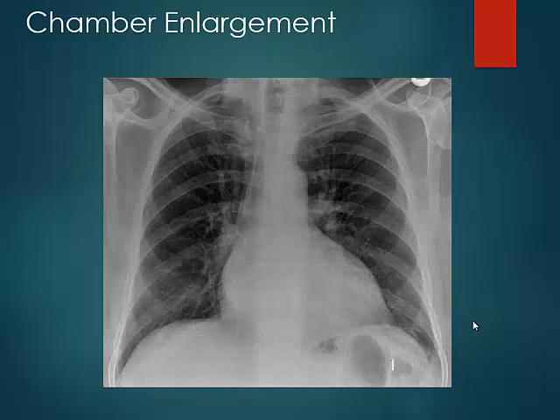So this patient again probably has left ventricular enlargement, and as you have told me, there is left atrial enlargement here as well with a double cardiac border. And another sign, as you know, is splaying of the carina, because of left atrial enlargement.